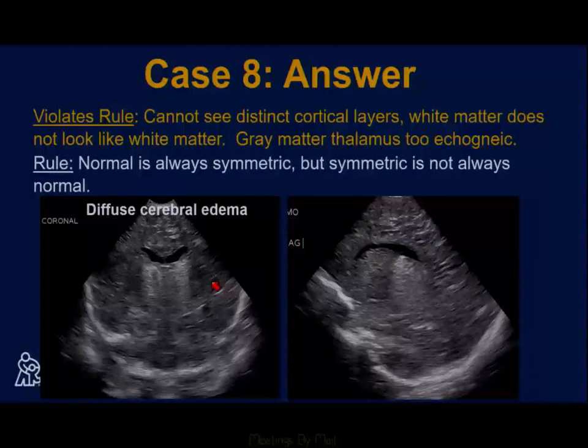And this is a really difficult one. And it can be really difficult at MRI with that diffusion-weighted image too, just because some of these pathologies are so generalized that I've been almost fooled on a lot of MRIs where I'm looking at the diffusion-weighted imaging. And because it's just so grossly abnormal throughout, you're missing the actual findings. And ultrasound suffers from that same pitfall.